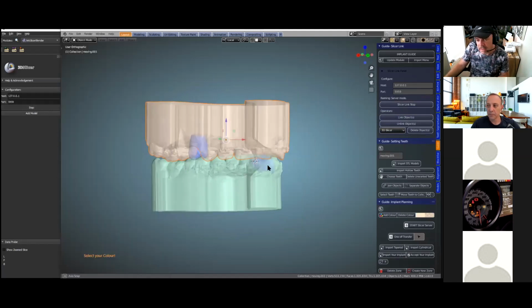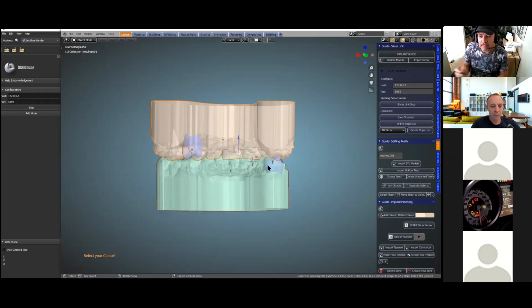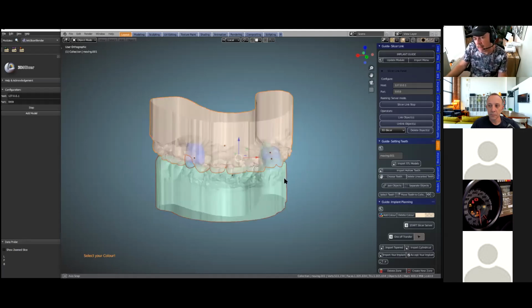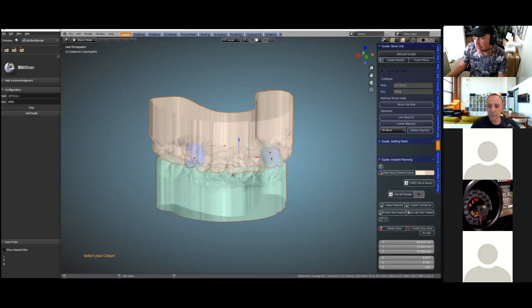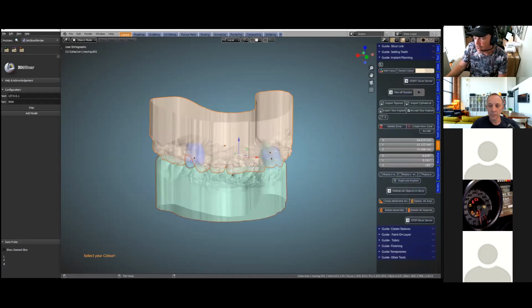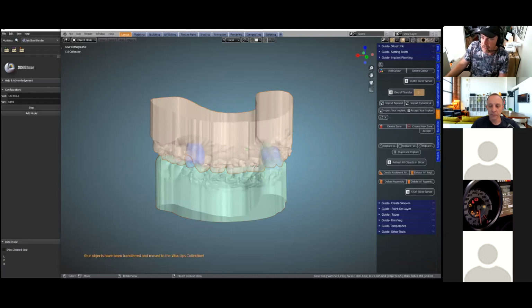Then what I'm going to do is I'm going to select everything on my scene. And because these models are quite big, they're dense, we're only going to transfer this across one time only, because we're working on this refreshing system. So let's close everything else. So in the implant planning, we're going to then look for the button one-off transfer. Hit that, and then this will come up, which means that it's been placed in a layer and then it's disabled. Now we can't click on this anymore.